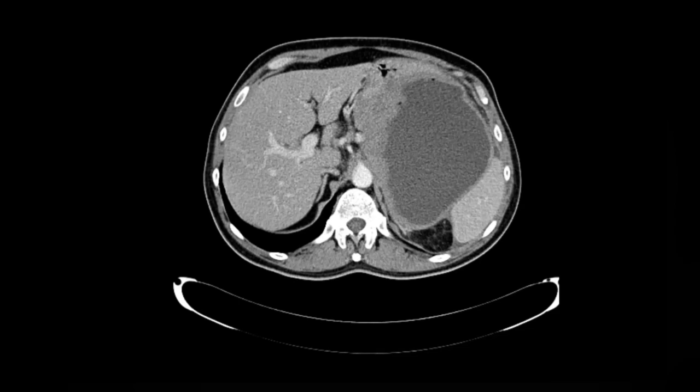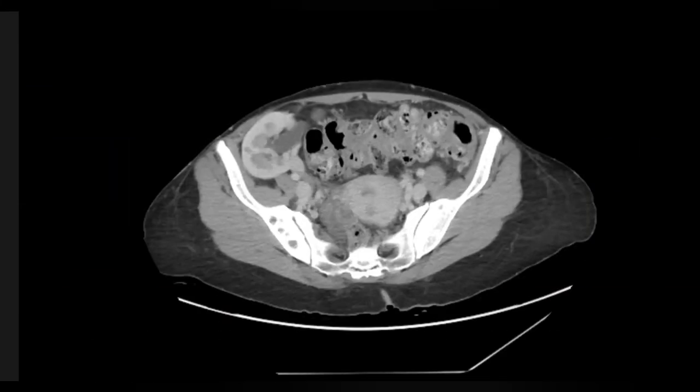One disease. Okay. Exophytic masses. I cannot think of any other differentials other than GIST and lymphomatous deposits. Melanoma, metastasized melanoma tends to be exophytic and can cause complications and connection with the cavities. Okay, thank you, sir. Thank you very much.